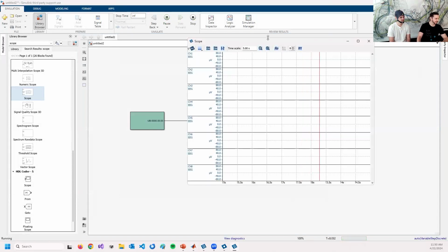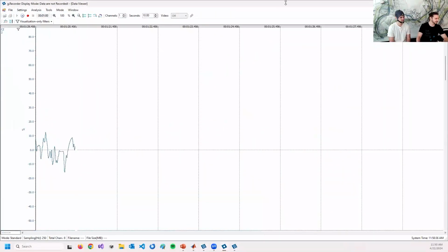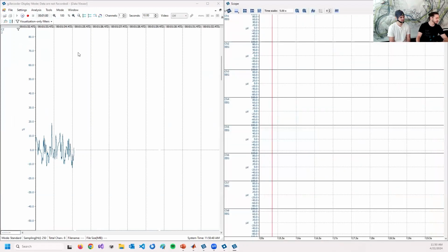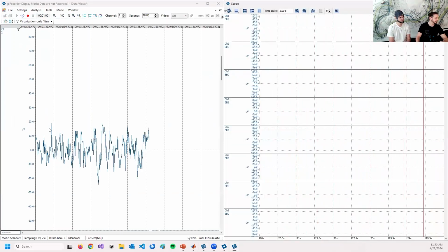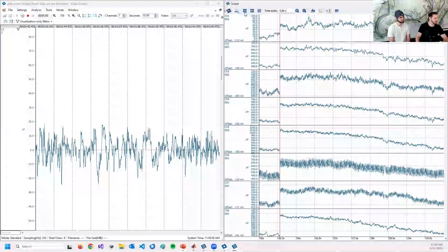And we can already see data coming in our research application and in our compiled application. So I can show it in parallel. On the left-hand side, we have the data in g.recorder with some pre-processed channel 2. And in g.tec, we are acquiring raw data right now.